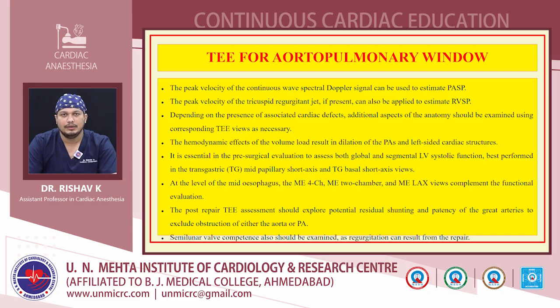We have to make proper sweeps of the transducer, and we have to perform proper maneuvers so as to visualize the entire lesion. The hemodynamic effects of the volume load result in dilatation of the PAs and left-sided cardiac structures, and it is essential in the pre-surgical evaluation to assess both the global and segmental LV systolic function, best performed in the transgastric midpapillary short axis and the transgastric basal short axis views.